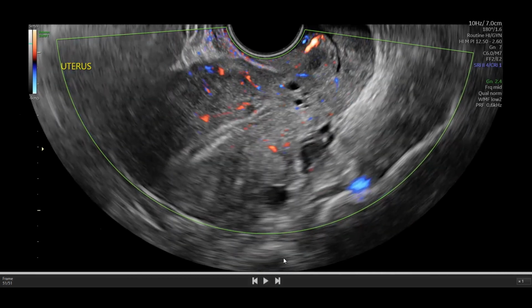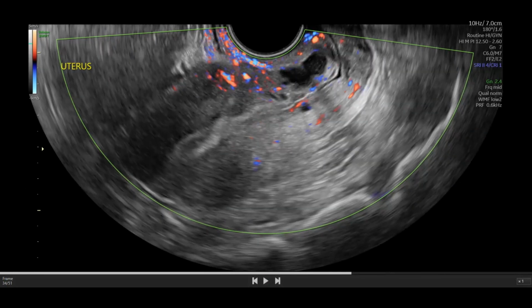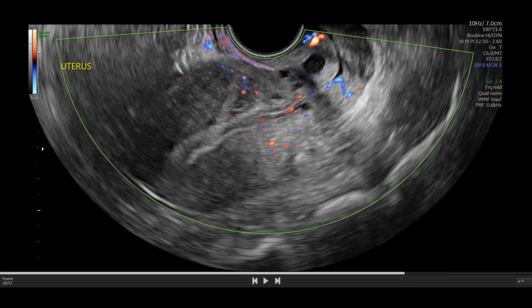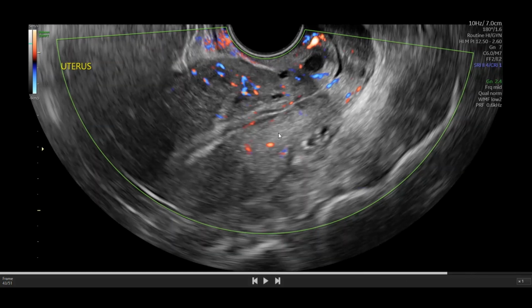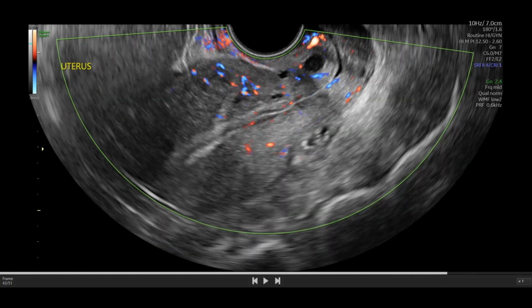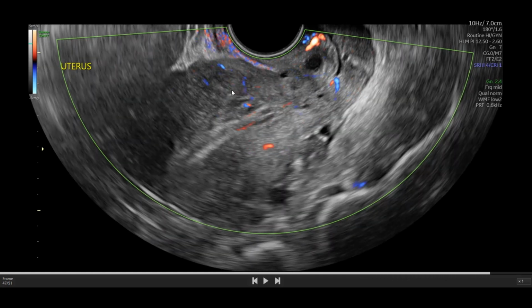vascularity. Now, in the context of a more focal adenomyoma versus a fibroid, it can help with differentiation. In this case, we do see maybe a little bit of a translesional vascularity type pattern here, kind of like finger-like projections. And we did note that that's where a lot of the adenomyosis was focused, in that anterior myometrium. So we might be seeing that vascular supply through those areas of adenomyosis. Not much otherwise.